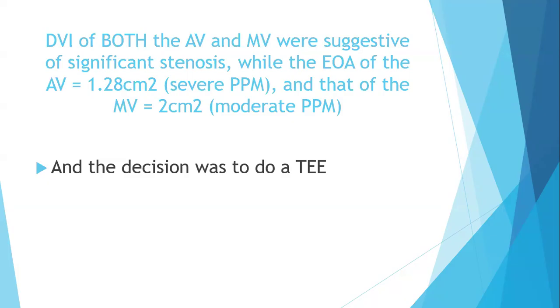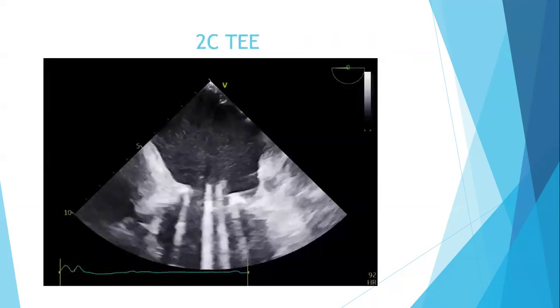Eventually, we have decided to do a better assessment by transesophageal echo for this patient.